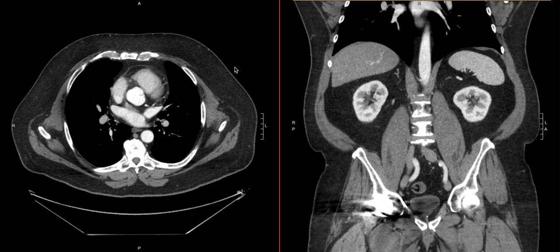Now we're going to discuss running the vessels, specifically the arteries, as part of our search pattern. We're going to start at the top, and because we do catch some of the pulmonary arteries, we're just going to look for a PE first. We're going to start by putting it on the abdominal window, which is what this is on. We're going to use the 2.5 millimeter cuts for this part of our search pattern on the axial, and then we have our coronal here to help us co-localize.